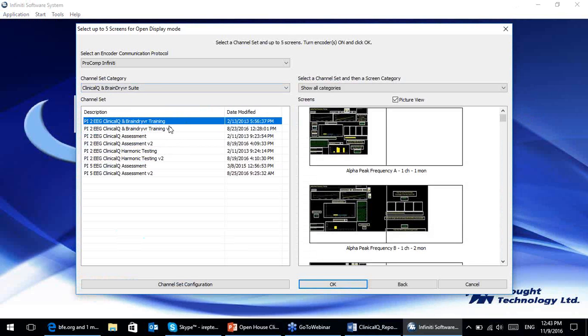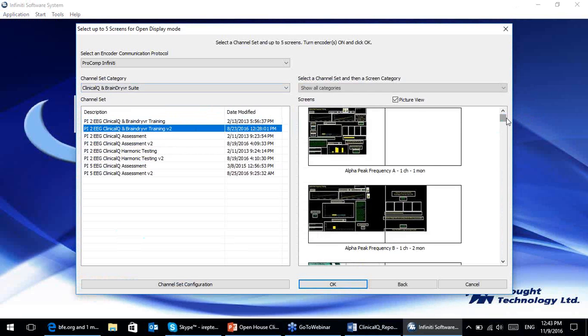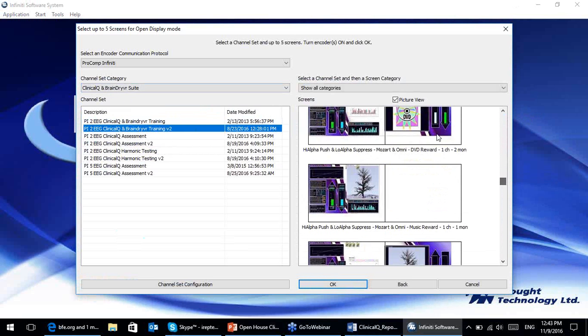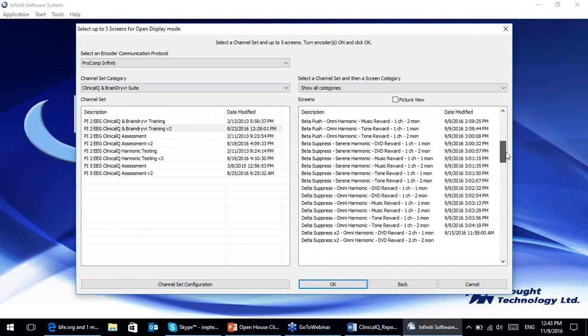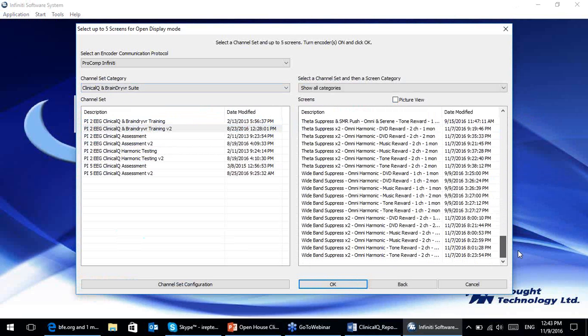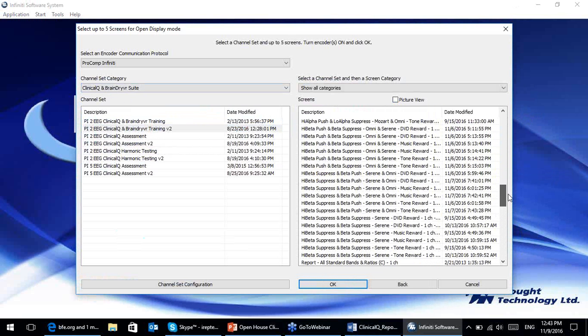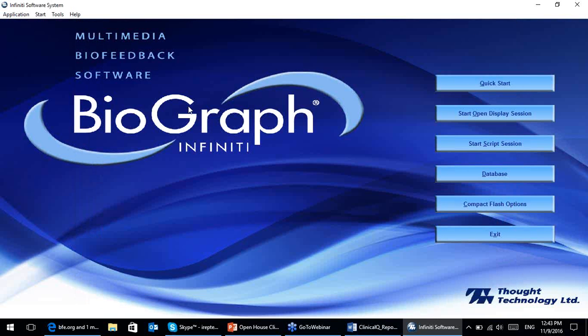So for me, it's straightforward. It's just version 2 compared to version 1. And in here we have the new types of screens and the new look for them. Like I said before, we have cut back on the number of screens. There's still a whole bunch, but we've deleted about 40% of them, and the ones that are remaining are much easier to understand, and they're structured in a much more straightforward manner. I'm actually going to show you a few just so we get a quick feel of what that looks like.